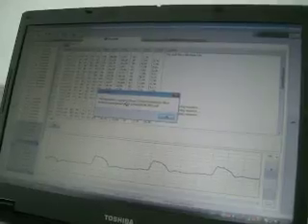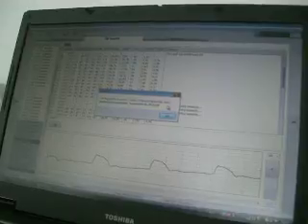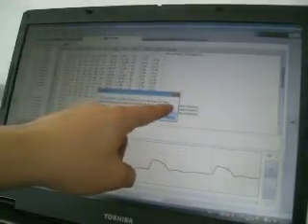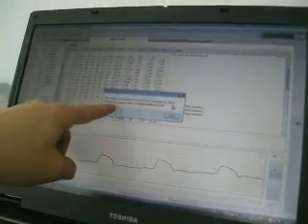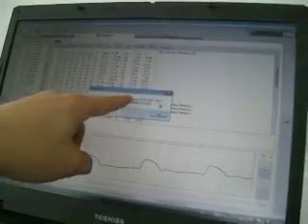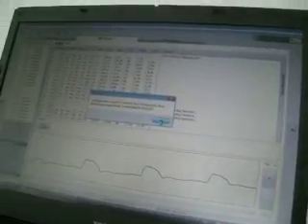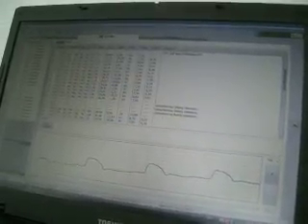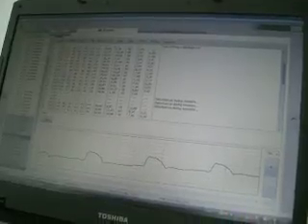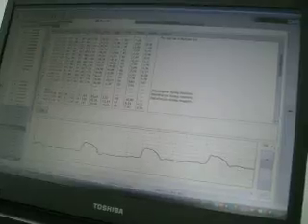Ready, the report file is saved to the desktop with an automatic naming, which is first the name of the user, second the name of the patient, and after that the date of the PDF generation. You can click OK.